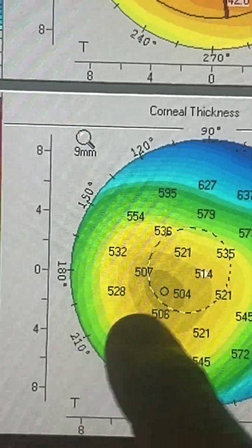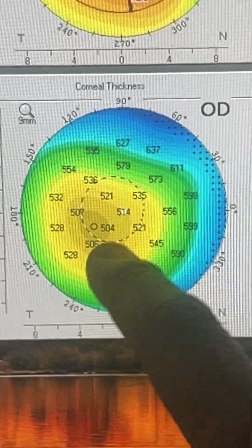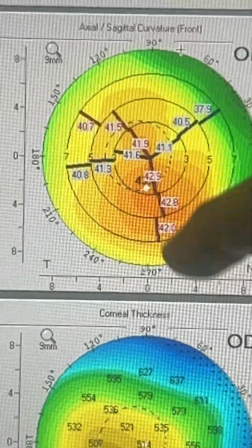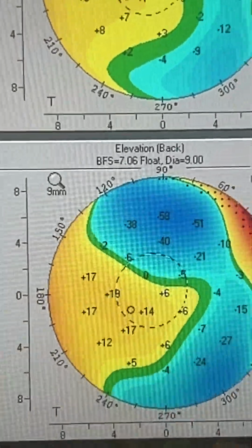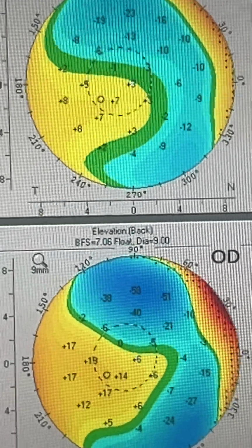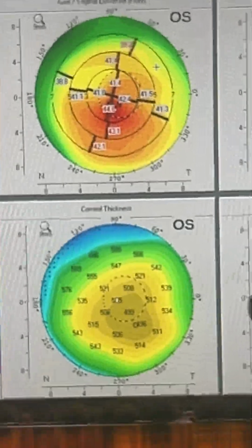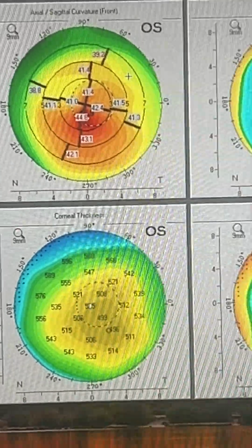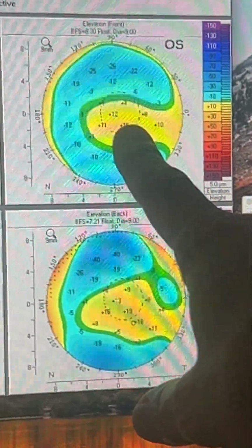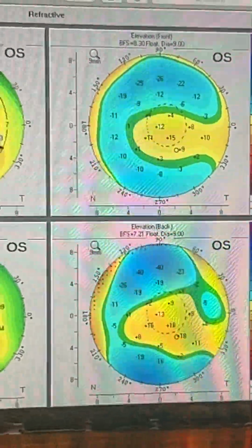So this explains the angle kappa that we're seeing here with the pachymetry deviation, but there's a lot of steps and there's very rapid change in the cornea thickness. There's truncation of the astigmatism, irregularity upper lower. It is evident also the posterior cornea curvature is far steeper than the anterior. And I know what you're thinking right now is epithelial maps; we'll get there. The other eye is worse, more truncation, thinnest cornea 495. And again, less angle kappa here, 460 microns on the x-axis and 70 microns on the y-axis.